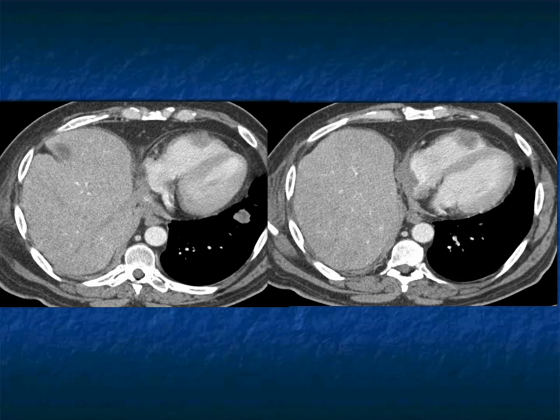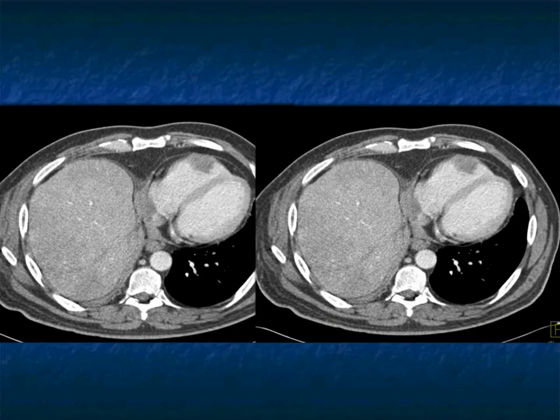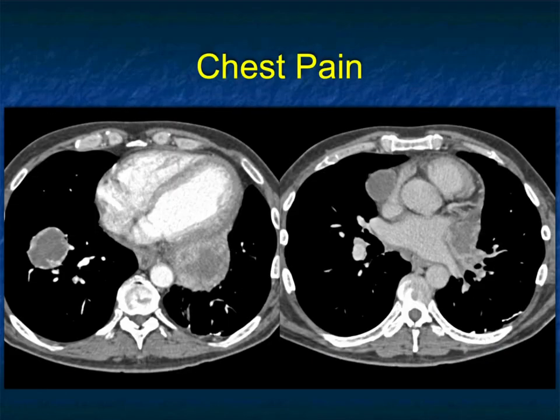And here it is again. You can see several lesions. There's lesions also on the patient's right atrium. There are also lung and liver metastasis. So just a very nice example of a pattern of metastasis. I think this emphasizes the point that when you're staging a range of different tumors, give a good look at the heart. Especially now with CT, with fast scanning, less cardiac motion, it's going to be easier to pick up even small implants to or on the heart. Again, very nicely shown here.